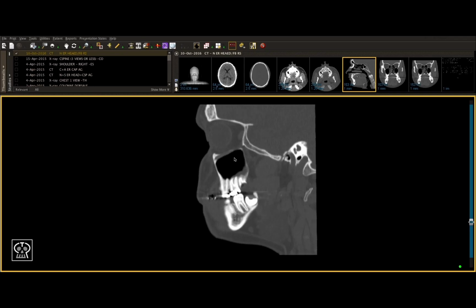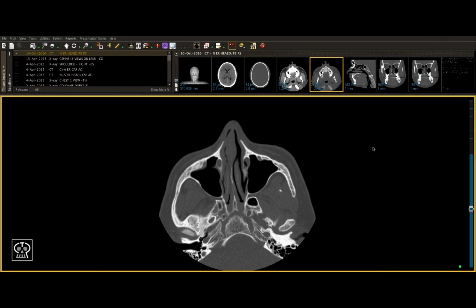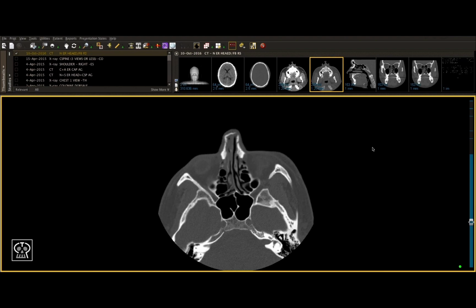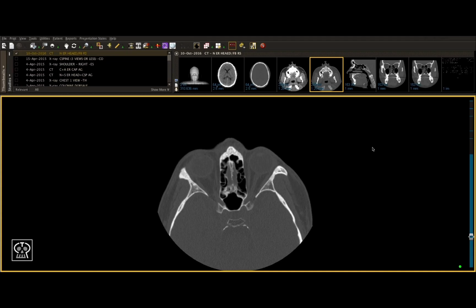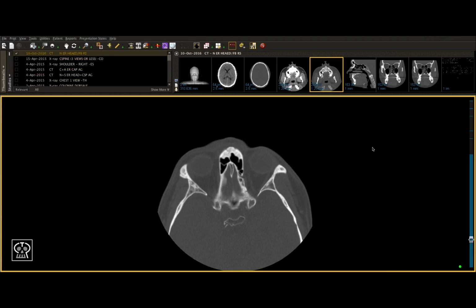After you are confident there are no fractures in this view, you would then move on to your final view. And contrary to our previous videos and modules, we'll actually be finishing with the axial scan. Although the axial view of the orbits does provide valuable information, right away you'll notice it's not as intuitive as the coronal or sagittal views and is a little bit trickier to navigate.